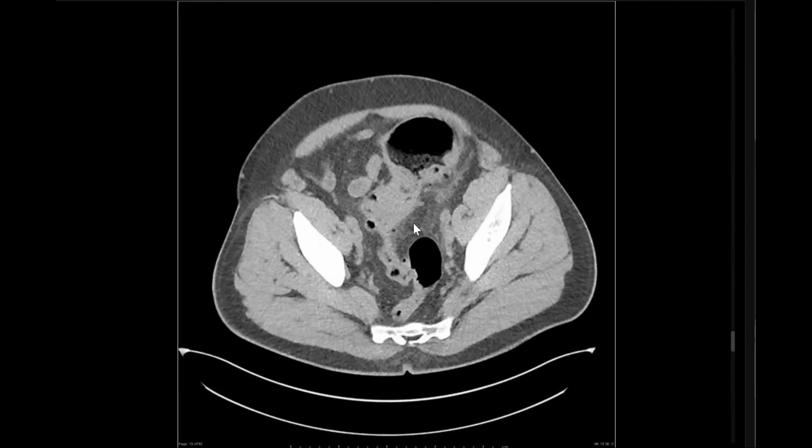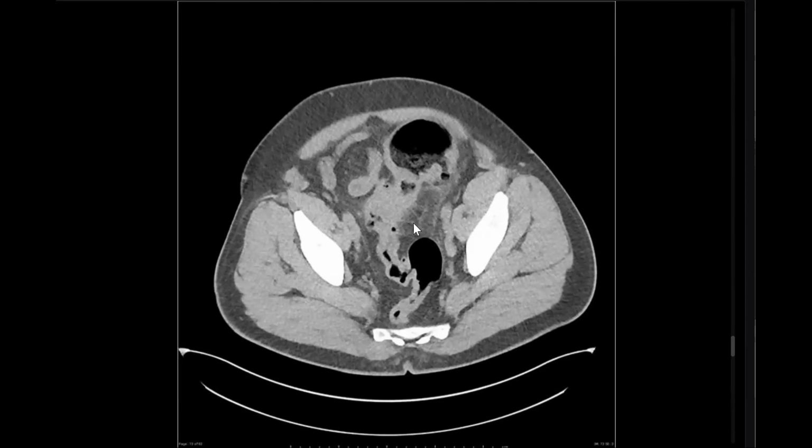Is this intramural air in old age, or diverticuli? Diverticulitis. Yes, because it could be different. It could be a case of chronic diverticulitis complicated, associated with sigmoid carcinoma at the sigmoid junction, or stricture. Very good. So yes, it may be a diverticular stricture secondary to diverticulitis, or it may be colorectal carcinoma on top of pre-existing diverticulosis. Very good.